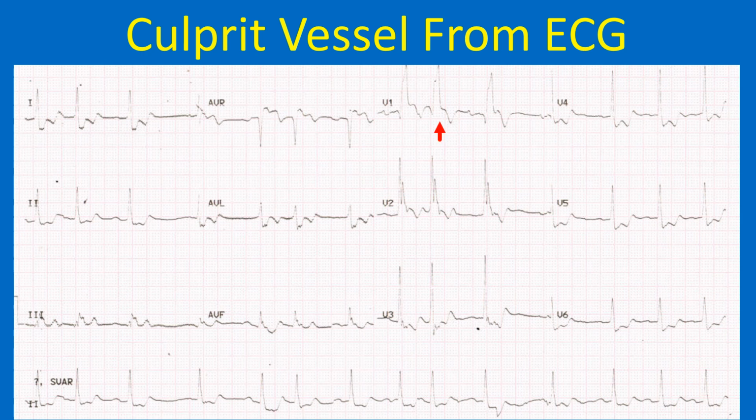In addition to ST elevation in AVR, this ECG also shows Q in V1 followed by a tall slurred R, QRBBB, indicative of anterior wall infarction with right bundle branch block. The initial R of the RSR prime pattern expected in right bundle branch block is knocked off by the infarction. Multiple supraventricular ectopics are also seen in the ECG.